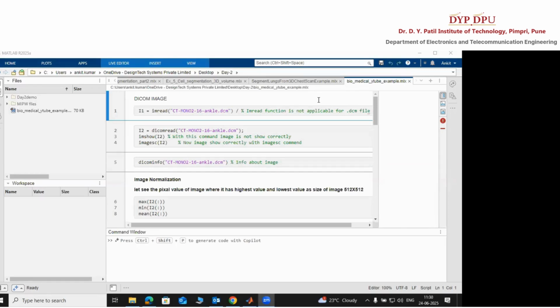Just click on that. After clicking, it will direct you to the MATLAB Drive. If you open your MATLAB account, then just copy it into your own folder. That's all you have to do, or you can use MATLAB Online also. So this is the MLX file. You have to open this.